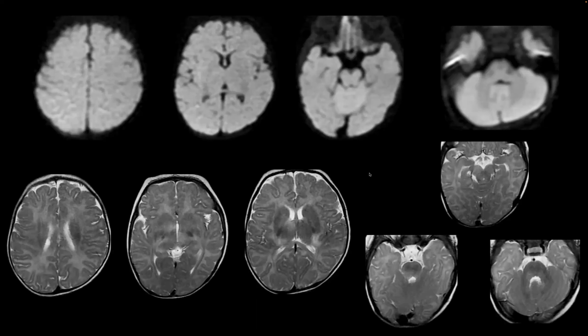Yeah, the only thing against infection was slightly uncommon was the absence of restricted diffusion. Usually there are some areas of restricted diffusion on the diffusion sequences. Not always, but given the acuteness of the imaging pattern after the clinical presentation, at least in the common infections, you would expect some areas of cytotoxic edema. So that was slightly atypical for infection only.